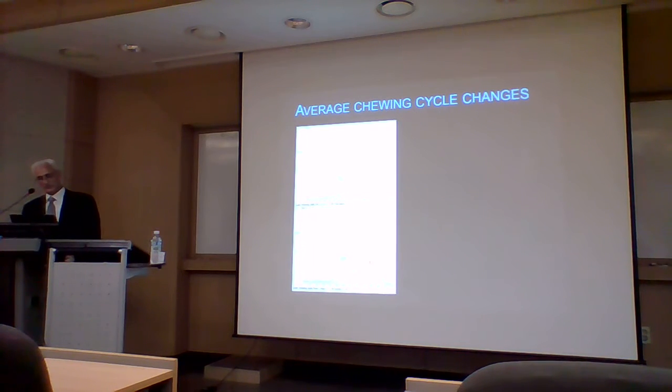This is a single subject's pre-treatment muscle cycle of a single chew. And this is post-treatment of a single chew. You can see the amplitude is much higher. There's not a lot of choppiness after treatment. There's much more smooth curves in the muscle from pre to post. What's the meaning of choppy? Choppy would be, they don't make a complete stroke. They stop, they slow down. Here you can see they make a continuous stroke. 치료하고 나니까 머슬이 뭔가 좀 덜 피곤해가지고 원활하게 운동을 하는 것들이 이제 피크로도 나타난다라고 하는 거죠.